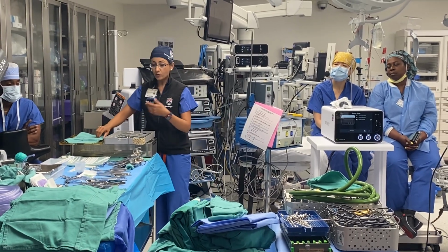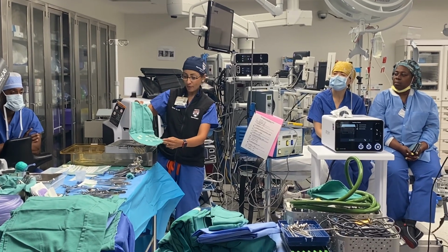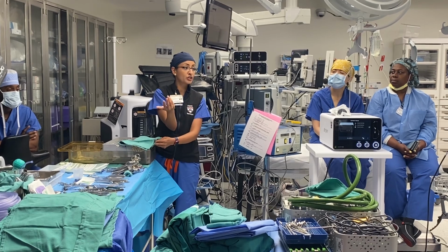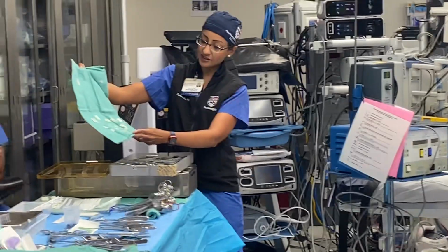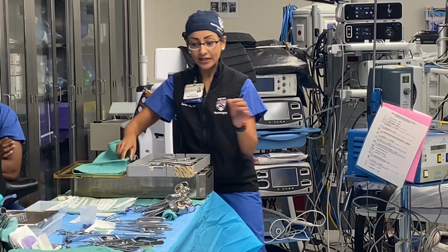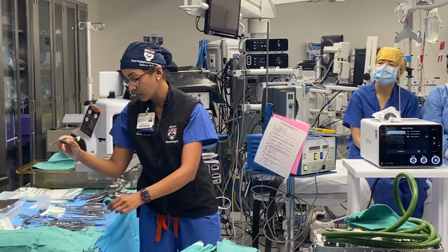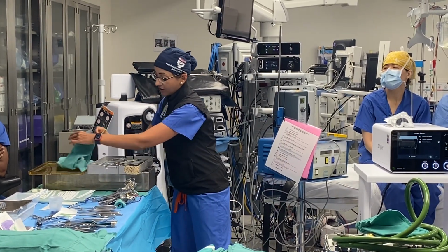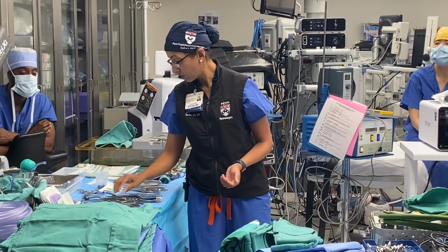Once we do all of that, we'll irrigate out the cavity, and then Melissa's kindly done a nice job here of setting up our Surgicel. We will use that typically to line the cavity of whatever we took out, right? These are good hemostatic agents, and we use a variety of different sizes and shapes. It doesn't have to be perfect. And we love neurosurgeons, as you can see, most of our instruments are bayoneted like this. So we will use our regular bayonet to take the Surgicel and line it into our cavity. That's kind of what we'll do there.